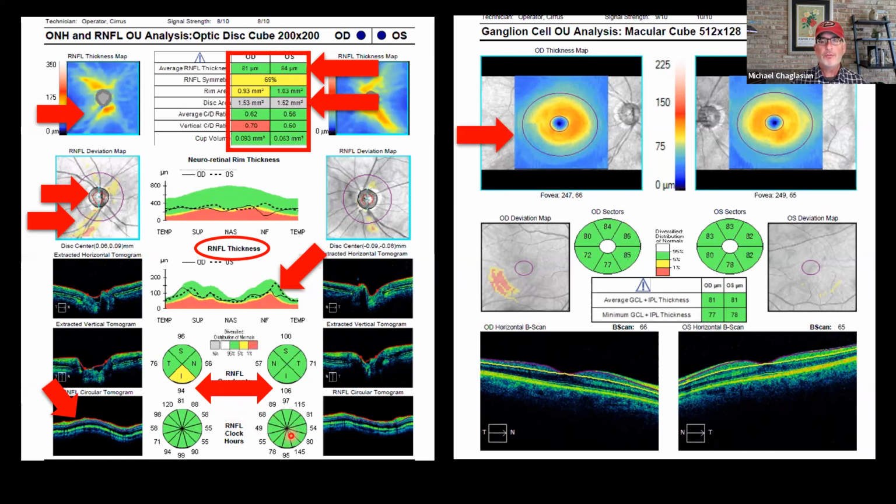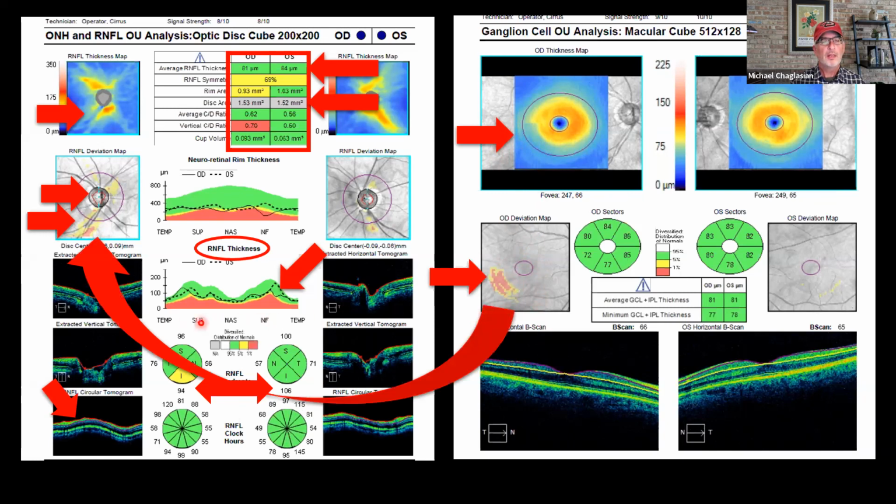And then I would go through and take a look at the ganglion cell plot for the right eye. Again, I'm highlighting this wedge defect that happened in here on this scan on the thickness map here for the right eye. It's likewise displayed on the deviation or probability map right down below. And all of this agrees anatomically with what's going on inferiorly for the retinal nerve fiber layer. And essentially, these regions are connected anatomically, and we'll talk more about that and how a new display can help us identify that in a couple of slides.